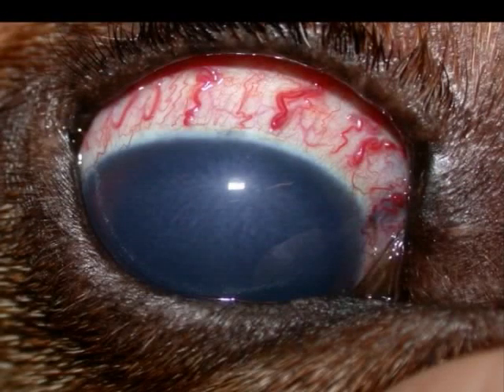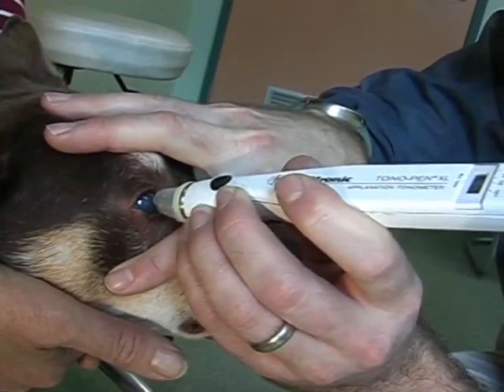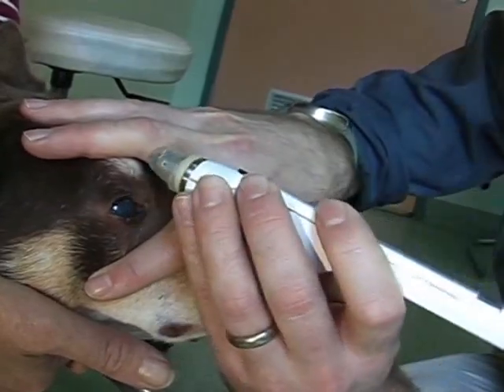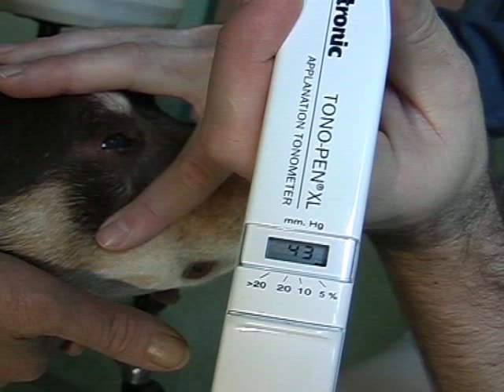Some clinical signs of glaucoma, such as redness and corneal edema, can occur with other diseases. These include uveitis, which may be accompanied by a decrease in intraocular pressure. Without a tonometer, diagnosis can be difficult, particularly if corneal edema interferes with intraocular examination. Glaucoma can cause irreversible blindness in less than 24 hours, so prompt diagnosis is vital if there is to be any chance of preserving vision.